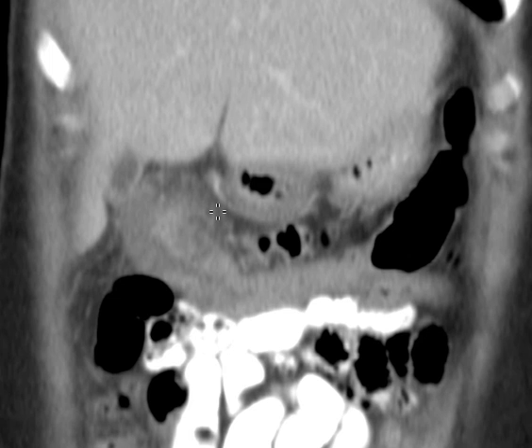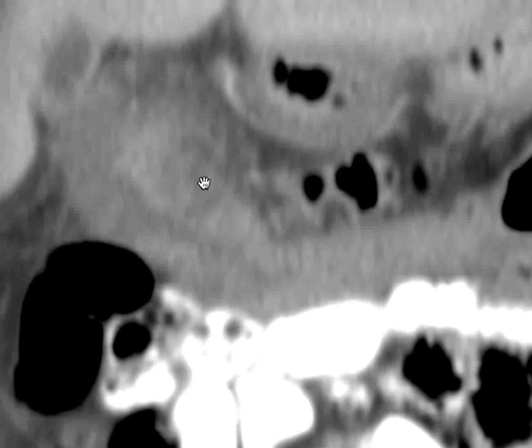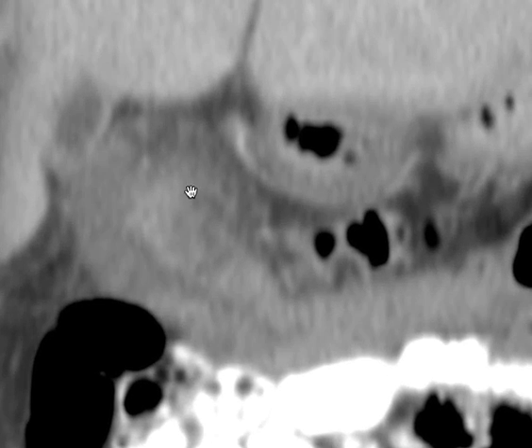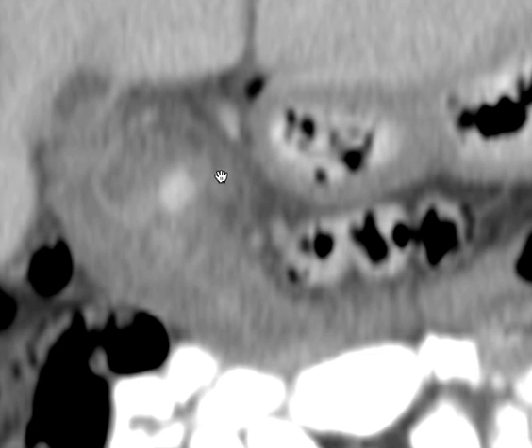This stranding right here is different than what we're seeing next to the bowel here. So even though this bowel wall is a little thick and it's a little thick over here, it's thick here too. It has a pretty sharp margin, but right here you see you have that pericolonic stranding, that edema, because this is where the diverticulum is, and this is where the most inflammation is located, and that's right near this diverticulum.